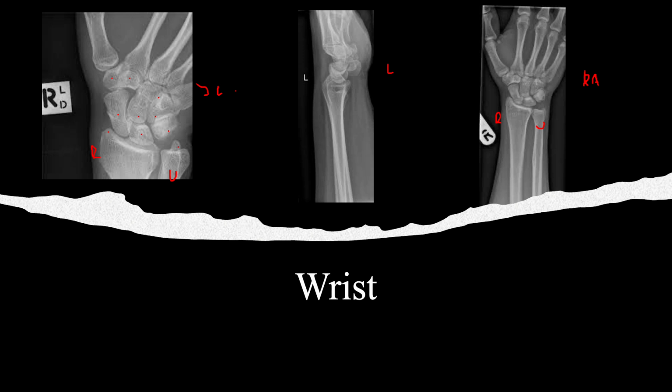So first off, I like to ensure that the styloid process is intact. It can be fractured, broken off in different fractures. You want to make sure that it's intact for both. You want to make sure that the articulating surface of the radius is intact, so that this is nice and smooth, that there are no disruptions. You want to make sure that there's no fractures that go through this anywhere.